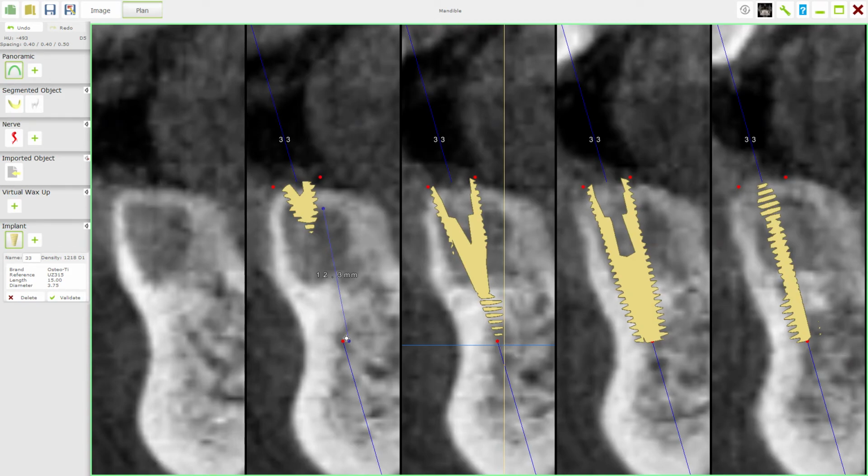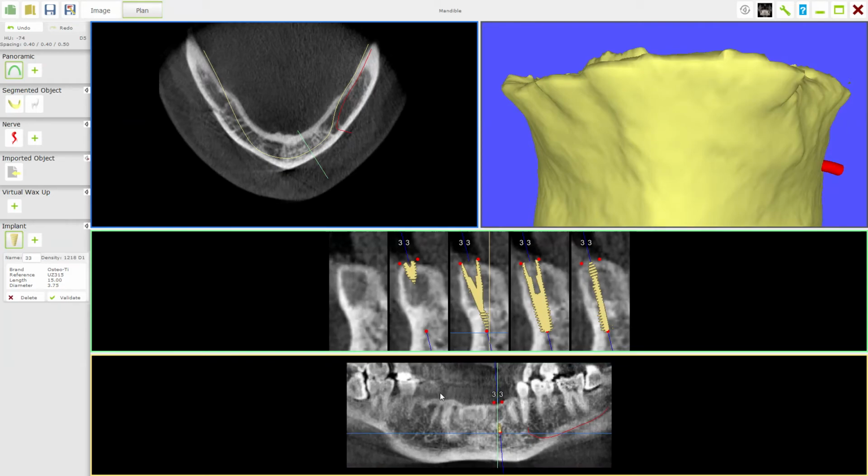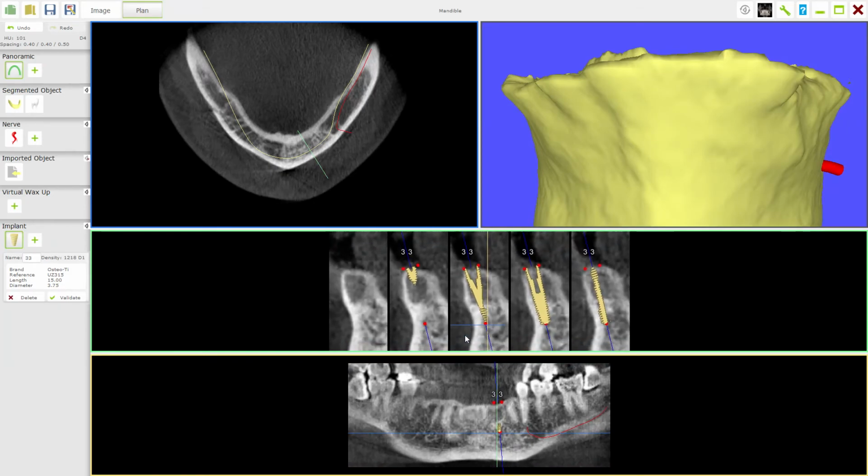Now remember, that's the mechanical stability that the bone gives the implant. So the more mechanical stability, the better the primary stability, the mechanical fixation of that implant, and your osseointegration success rate goes up. So you don't want to go unnecessarily losing primary fixation by increasing the size of your osteotomy site when it's not needed. So again, this is a very good ability for you to be able to do this and really look at things and really understand what's going on.